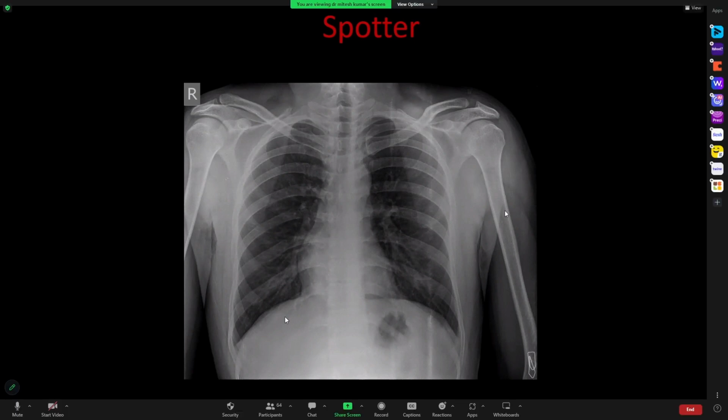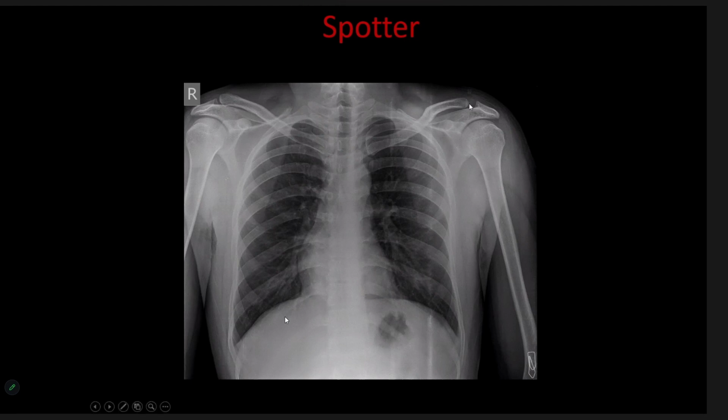Yes, left acromioclavicular joint widening. So this is again suggestive of ligament injury. Now compare this with the right side. Right side is absolutely fine. Less than 3 mm, I guess, is normal, and there is no step-like defect. The line from the inferior cortex of the acromial process is touching the clavicle. So this is left acromioclavicular joint widening.